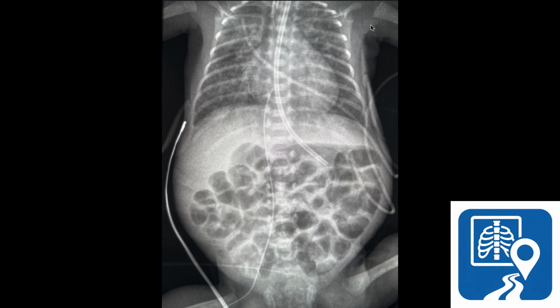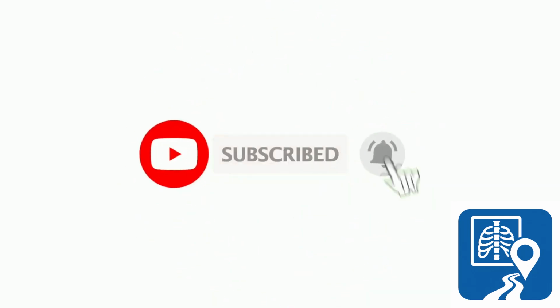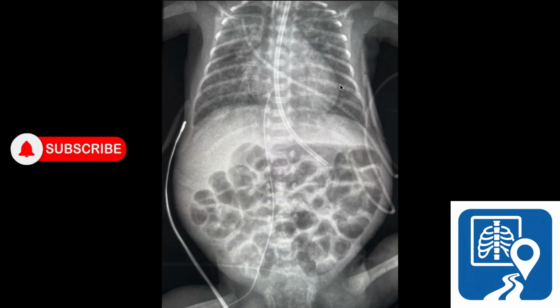And then also, we want to look at the cardiac silhouette. It seems to appear normal in size here. And then moving on to the abdomen, we want to make sure we see gas.